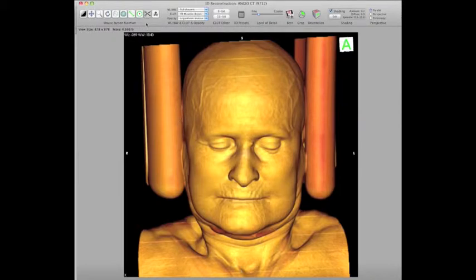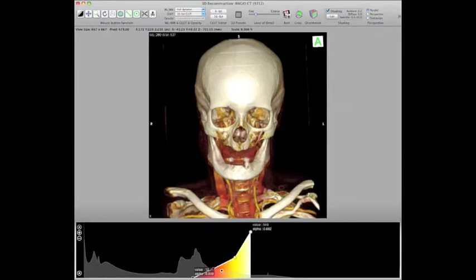And again, the way we got black there was to take the scissor tool, draw around an area, and then hit delete. Okay? Now then, click on 16-bit, and notice our collarbone came back too.